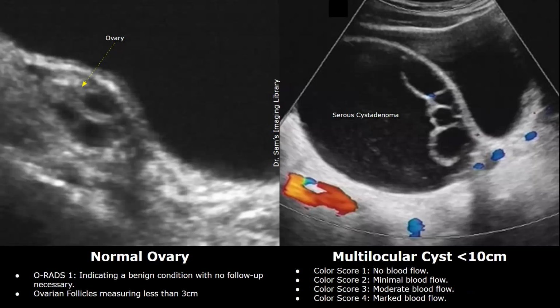Color score refers to the amount of vascularity seen using color Doppler. Color score 1 is no blood flow, no vascularity seen. Color score 2 is minimal blood flow. Color score 3 indicates moderate blood flow. And color score 4 is intense hypervascularity or marked blood flow.